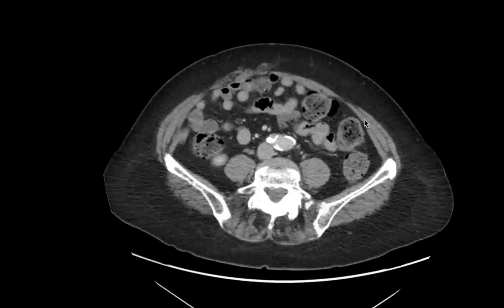The reason I'm asking what you would look at is because these are your review areas. Like we have review areas for the chest, there are review areas for the abdomen, which you mentioned quite nicely. The only thing you haven't mentioned is that you mentioned mesenteric stranding, but I think you need to mention mesenteric deposits. Okay? This is what you need to look for in every single case.